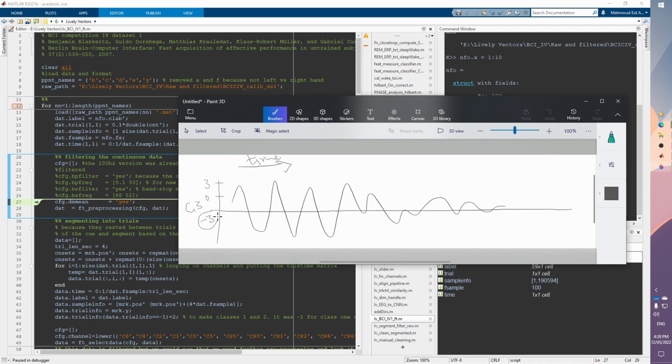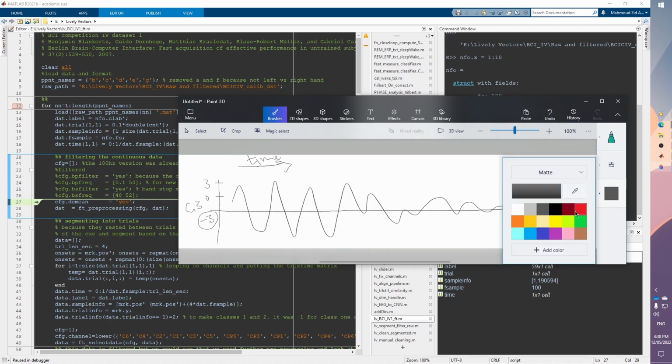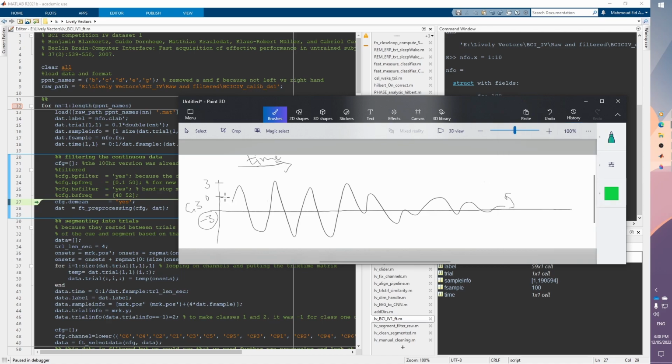And it will be subtracting -3 from all of the samples. So from each sample we subtract -3. What this will do is bring the mean to 0, which is nice actually to see. So we can say that our signal will be moved to have a mean of 0, and we will see why this might be important and nice to have.